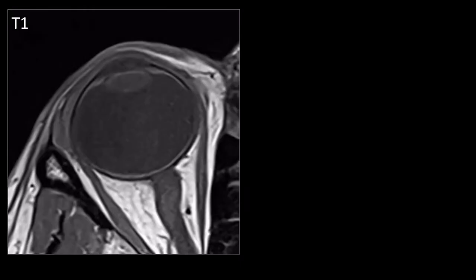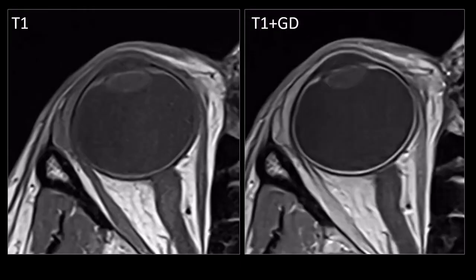On T1 weighted images without gadolinium, the choroid is T1 hyperintense, and if you give gadolinium, because it's a very vascular layer, it will enhance. And we see a nice enhancement of the choroid layer along the eyeball. And the most anterior component over here corresponds to the ciliary bodies, and we can't really see the fibers of Zinn, but they are there. There are very small fibers of Zinn connecting the ciliary bodies to the eye lens.